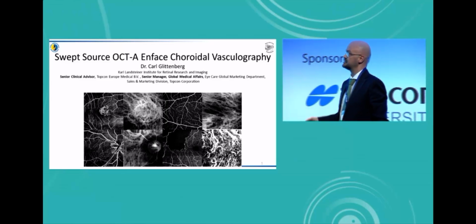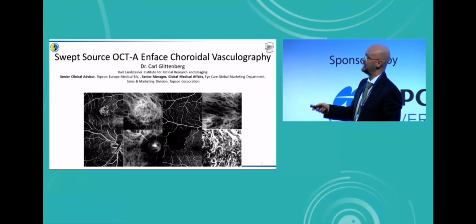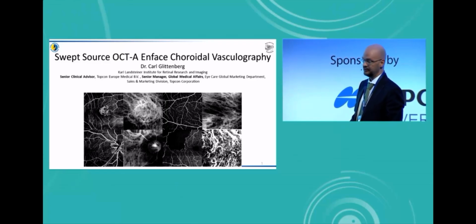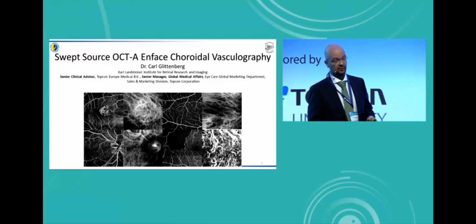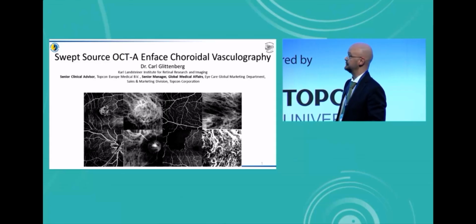I'm going to be discussing swept source OCTA en face choroidal vasculography to see if it's possible to actually visualize the choroid in a different way using the data that we have in swept source OCT.